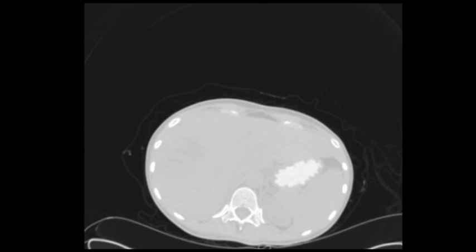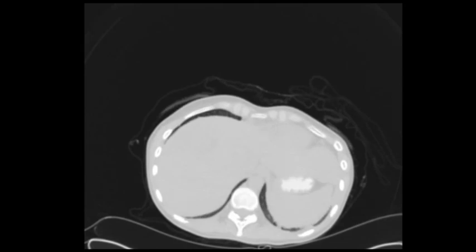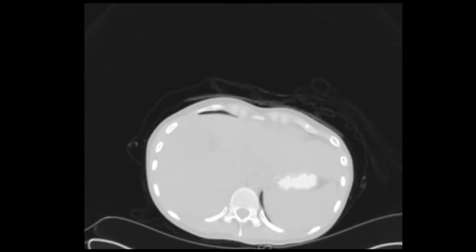When more than one detector is not working, these artifacts get bigger and bigger, and the images will be in very bad shape. So you need to call the engineer and replace some detectors. This is part of the physics that you, as a radiologist, have to know to make good images.